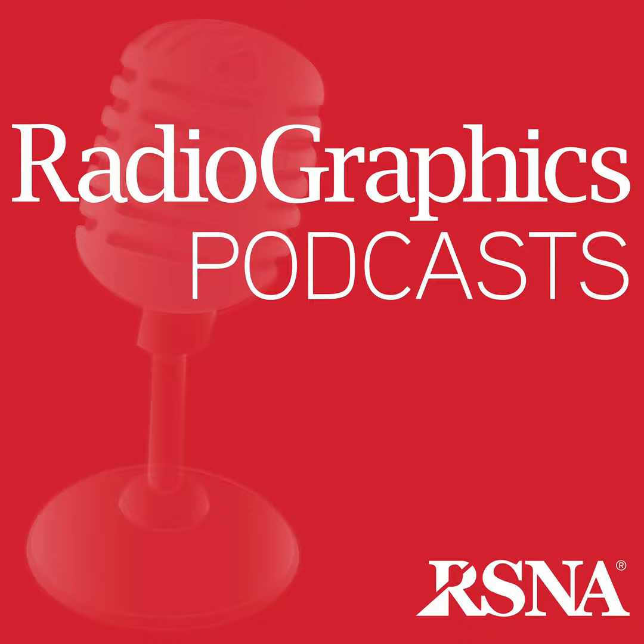Finally, in this section is the angiosarcoma of the thoracic aorta, which is a rare entity. This diagnosis should be entertained when you see a large intravascular filling defect with a lobulated morphology, particularly in the absence of aortic atherosclerotic disease or aortic dilatation.